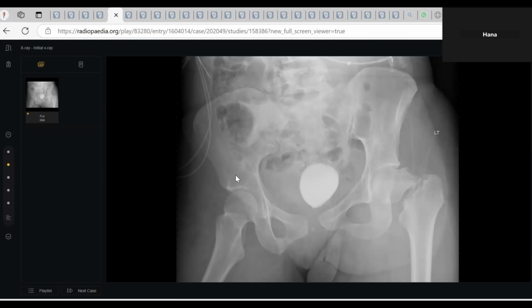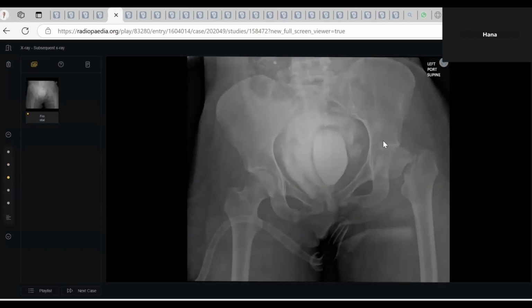Either we follow the rest of the sequence of the ascending cystography or CT. The examiner gave you this one. You see a contrast extravasation around the bladder, and look here at the urethra, it extends down. So it may also be associated with a urethral injury.